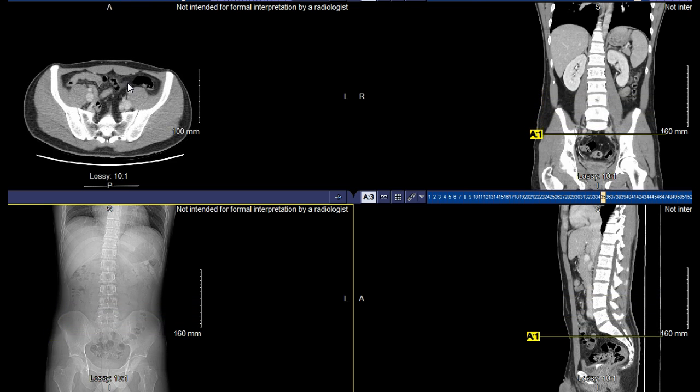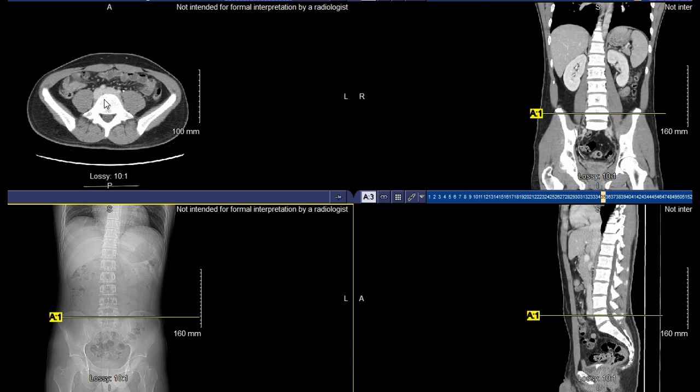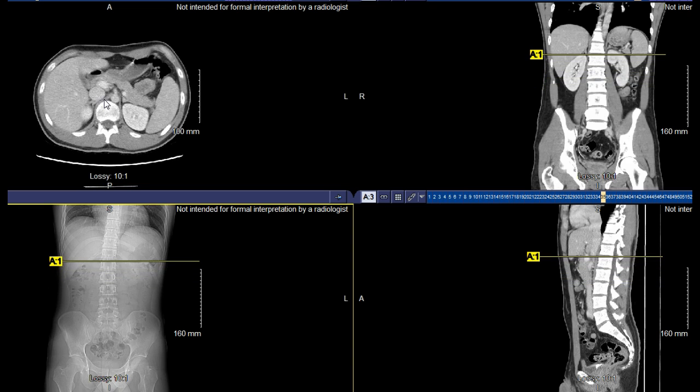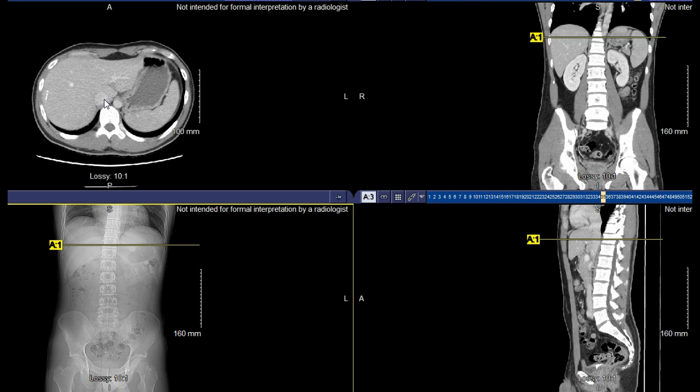I don't want to put an overemphasis on the structures of the bowels themselves at this point, but definitely know the stomach and know some of these other structures that I've highlighted and emphasized going forward. If you have any questions, be sure to let me know.